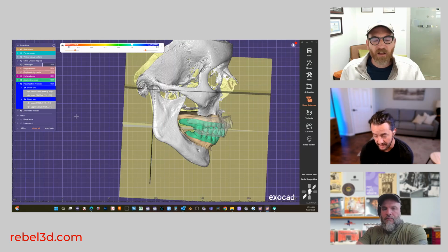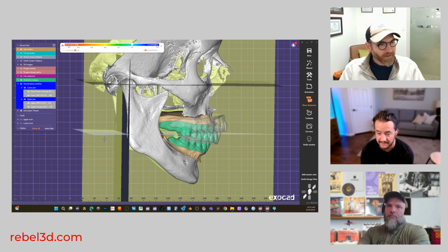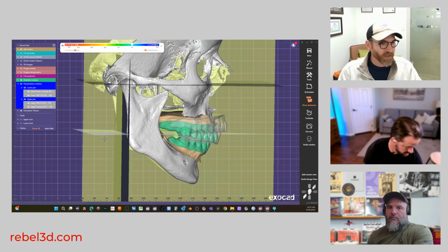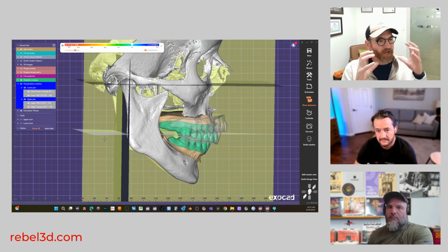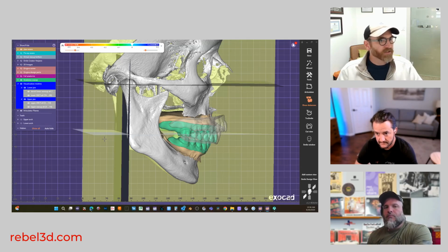Is it mildly significant or severely significant based upon the differences here in these mountings? So TMD is pretty complex, and so it could be related. You could get muscle strain if you were off on the bite in your pre-op records, and you are telling them to get into that bite, and they're having to fire a lot of muscles to get into that space because of some errors in the pre-op.